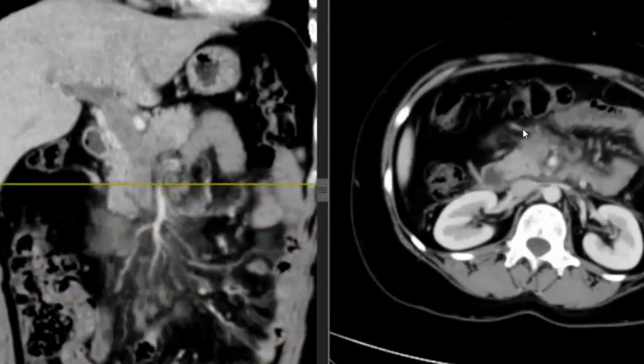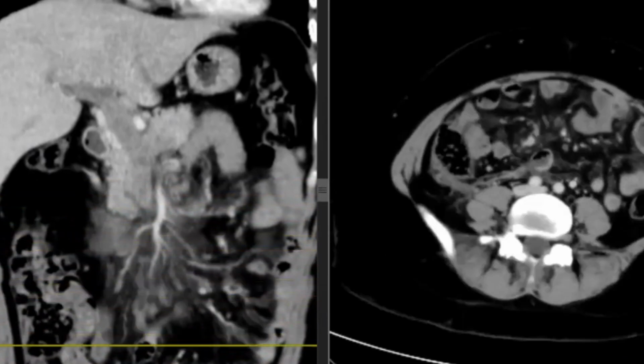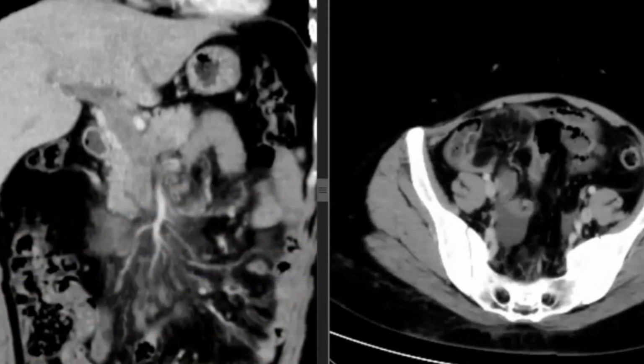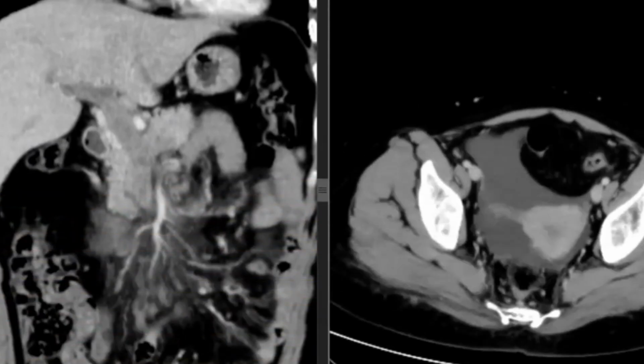You see the bowel loops are edematous. They are not infarcted because it is not the SMA. They are congested because it's the SMV. Nice, perfect. What about the cause of this? It was a case of oral contraceptive use.